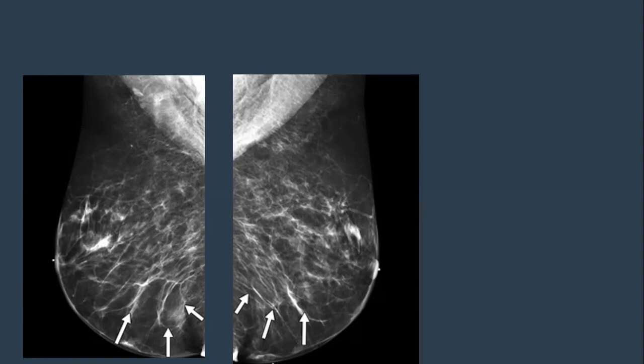So why the skin here? It looks like an irregular skin, on both sides. It's not a smooth skin. Look for the skin here. Straight and smooth. Look for the skin here. Yes, mildly, but symmetrical and smooth. But here, look for the skin. It looks wavy, bilateral wavy.